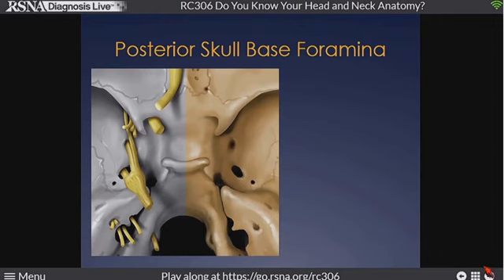So again, on our axial representation, we can see the cranial nerves on your left. On the right, nothing is depicted. So the jugular foramen again, and then we do that little bit of landmarks. Foramen lacerum, petroclival fissure, back to jugular foramen. Very consistent landmarks and allows you to very easily identify pathology or to see those normal foramen. Remember again, the jugular foramen is at that plate developing between the petrous segment of the temporal bone and the basiocciput. Foramen lacerum filled with cartilage, we don't care about that too much.